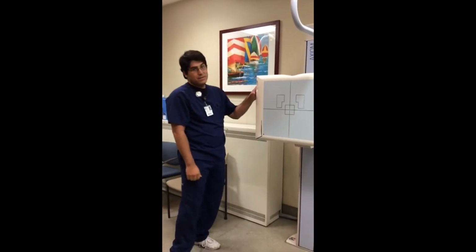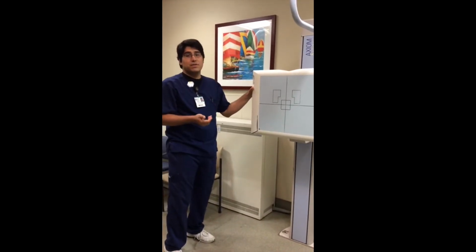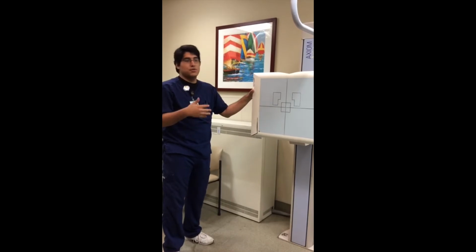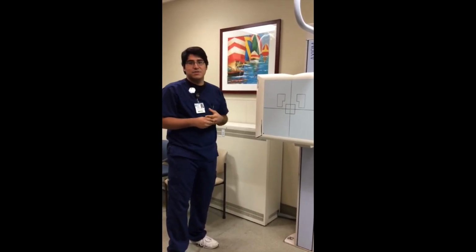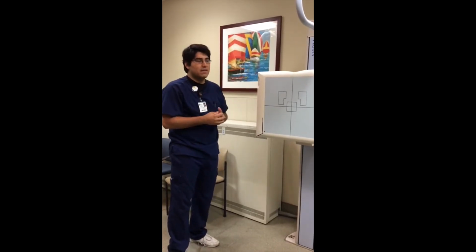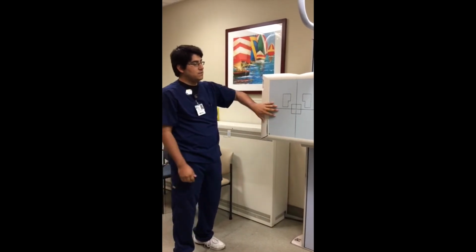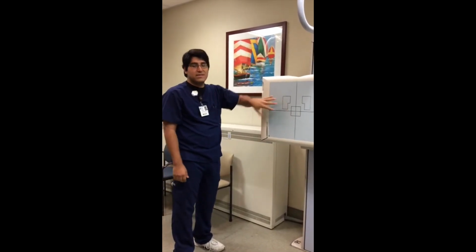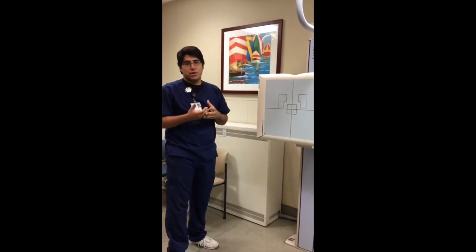Okay, so to continue, you guys have probably heard the expression, oh, photo time, just use photo time. In reality, photo time is actually an outdated expression. We don't really use photo timers anymore when we talk about AEC chambers. What we do now is we use just the chambers, and once they get ionized, once they're filled up, then the exposure is cut off.